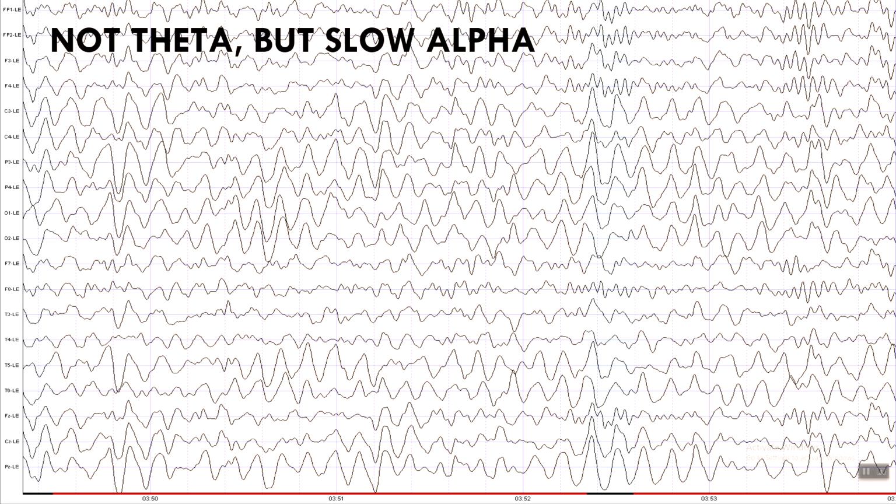So Jorge was asking how do you know if it's that frequency, if it's alpha versus theta. For instance, right here, what we have is a nice sinusoidal diphasic alpha. Sinusoidal because we have the same shape, diphasic because we have the same shape on either side of the baseline, meaning two. Diphasic, biphasic, synonymous terms. Sinusoidal meaning it's like a smooth S, like a sine wave, right? Alpha is sinusoidal. That's the shape of alpha. There's other sinusoidal frequencies, but that's how you recognize alpha.